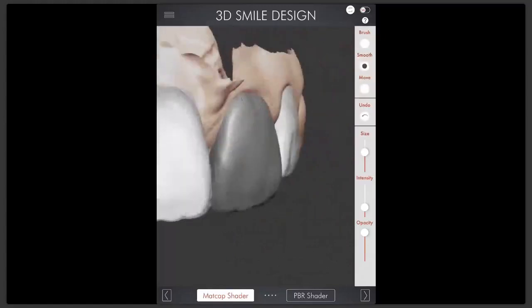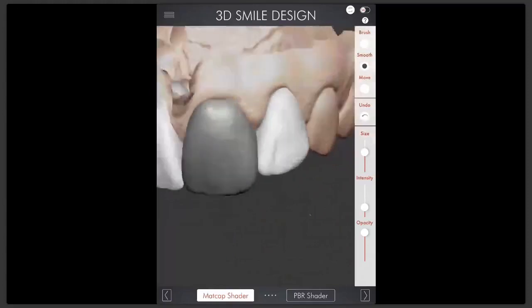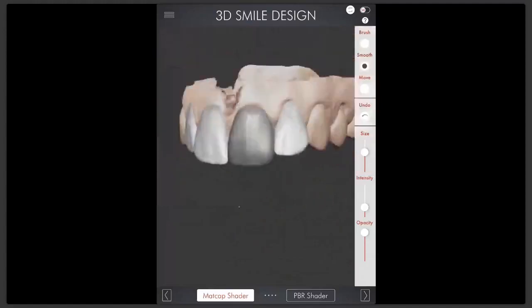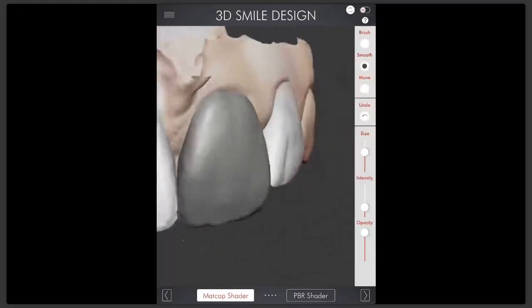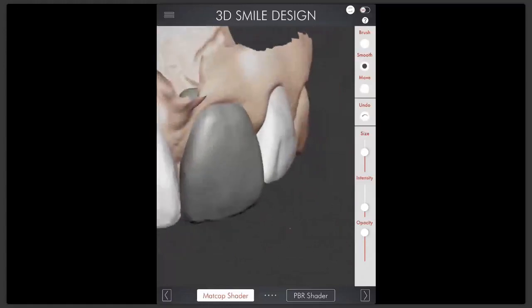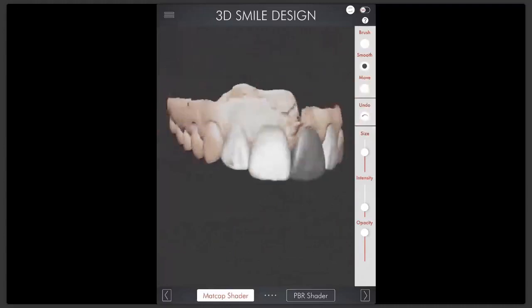You can see the texture of this design is really nice, but when we print, we are looking very close. So when we print, we cannot see these minor areas seen here from the sides of the edge. So this is okay. We don't need to smooth that out. Also here, so let's go to the other side.